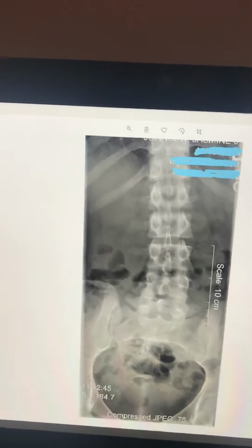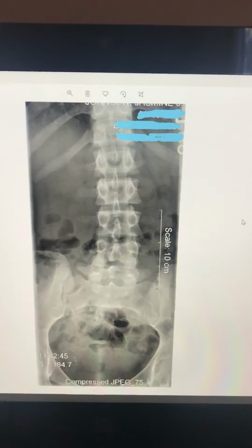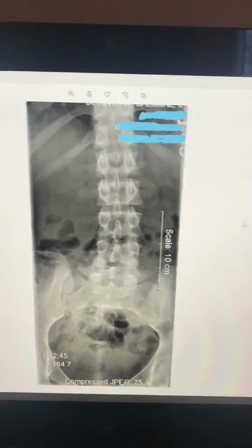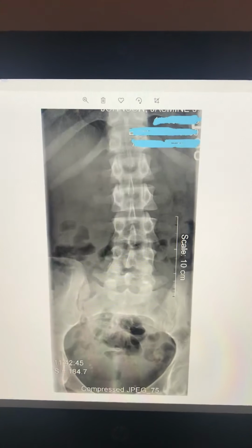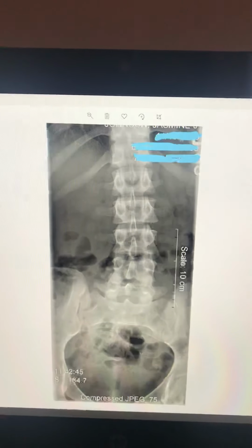7/13/2020. The reason for the request was a motor vehicle accident, and she had a previous accident, I believe, a month before this. So 2 accidents. The projections are AP, lateral, and a spot. She is female, 23 years old. She was transported by wheelchair from the ER.